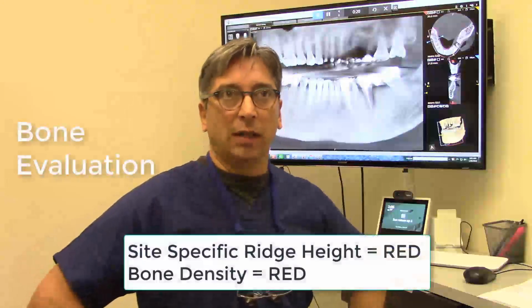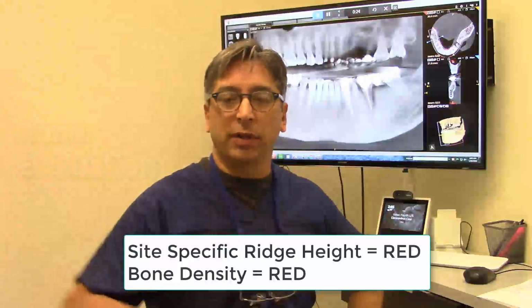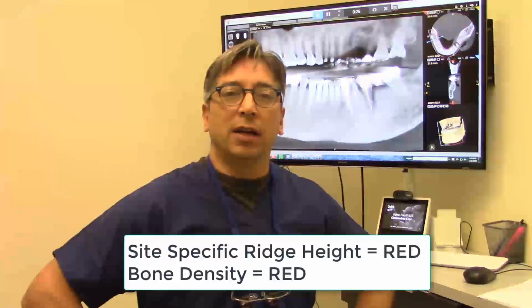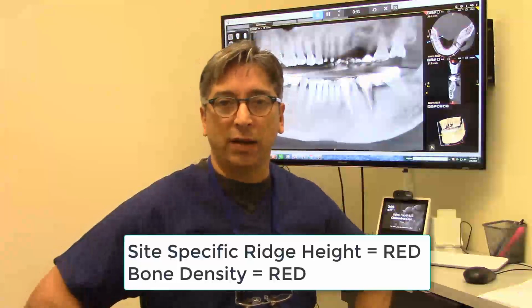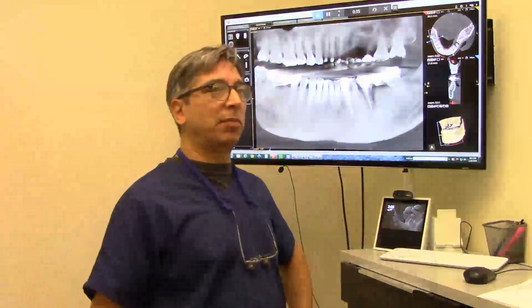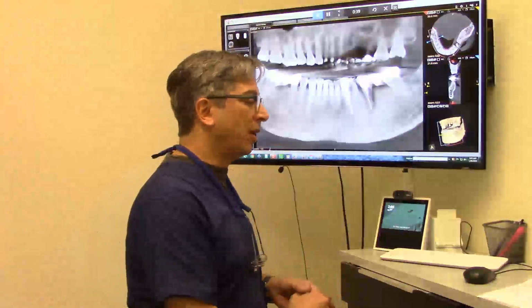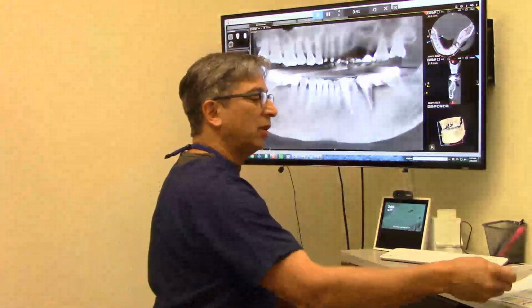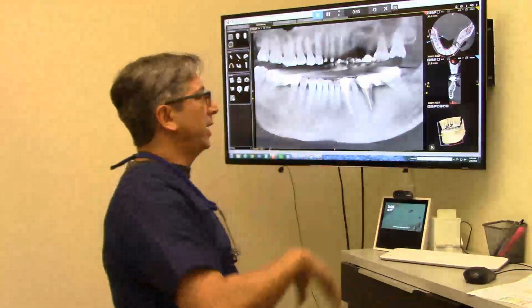Okay, bone evaluation. This one in particular is an example of a site-specific ridge height problem. So you can designate this as ridge height. It's in the red, and it is also very much a red for bone density. So those are the two examples. The other things, nerve, IA nerve, facial bone, aren't really our concerns at this point with this case.